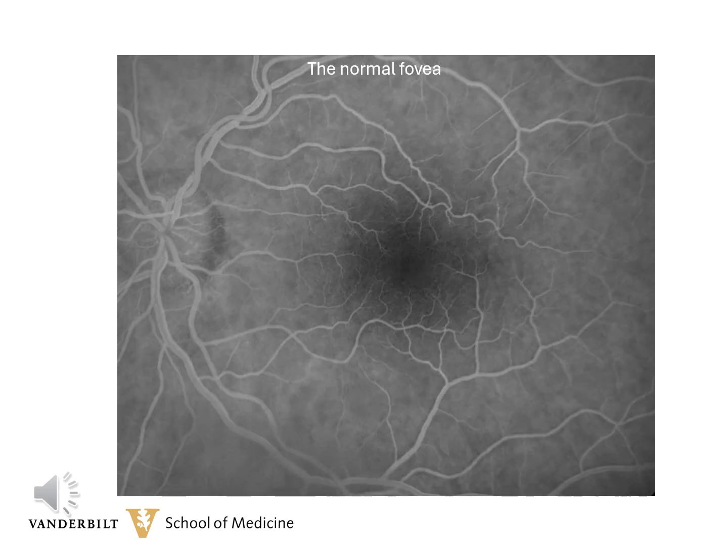Here is a normal angiographic pattern of a normal fovea. There's normal hypofluorescence in the fovea caused mainly by the presence of melanin, xanthophyll, and lipofuscin. There are several reasons for this. The macular RPE cells are taller than surrounding RPE cells and contain more melanin and lipofuscin.